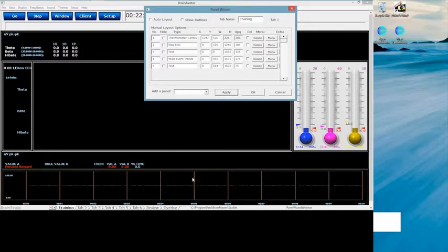And now, as you can see, like I said, this is making it very tight right now. But it gives you the ability to make it fit for your resolution. And so now I've taken this screen and fit it for a resolution of 1600 by 900 when it was originally developed on 1920 by 1080.